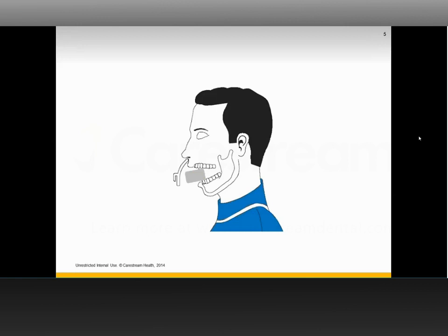Motion artifacts are one of the major reasons why scans don't look good. And again, let me emphasize over here, the fast scan mode is the best way to go. When you keep the mouth open for as short a duration as you can and use the fast scan mode, you're able to avoid probably the most possibilities for capturing any kind of motion artifacts.